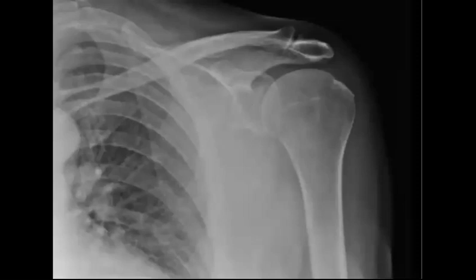I see that you are very active. Yes, so the lesion is exactly here. Perfect. So try to trace the scapular border here. You will find that there is a soft tissue lesion, so a destructive lytic lesion probably, or destructive lesion at least, with soft tissue component.